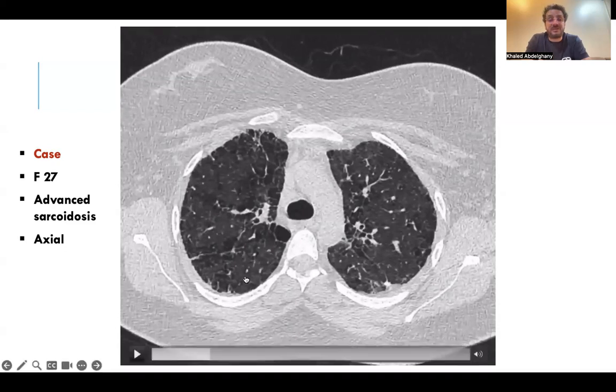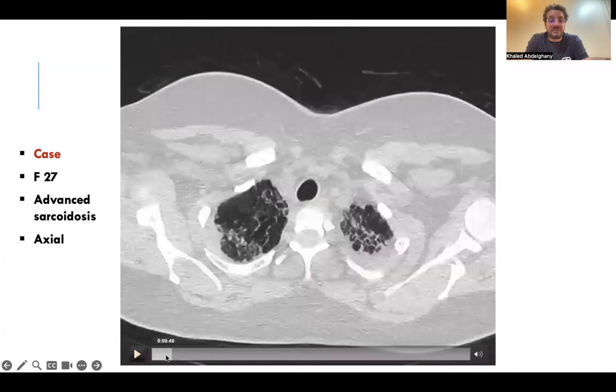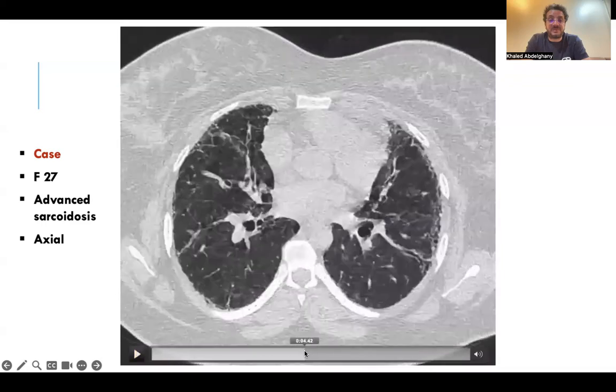Here I show you the 2023 scan because it's a stationary course. If you are interested to have a look at the other scans, I will put a link for the other scans, which I shared in a post on Twitter. Let us discuss the case with our systematic approach that I was always emphasizing and insisting to mention.